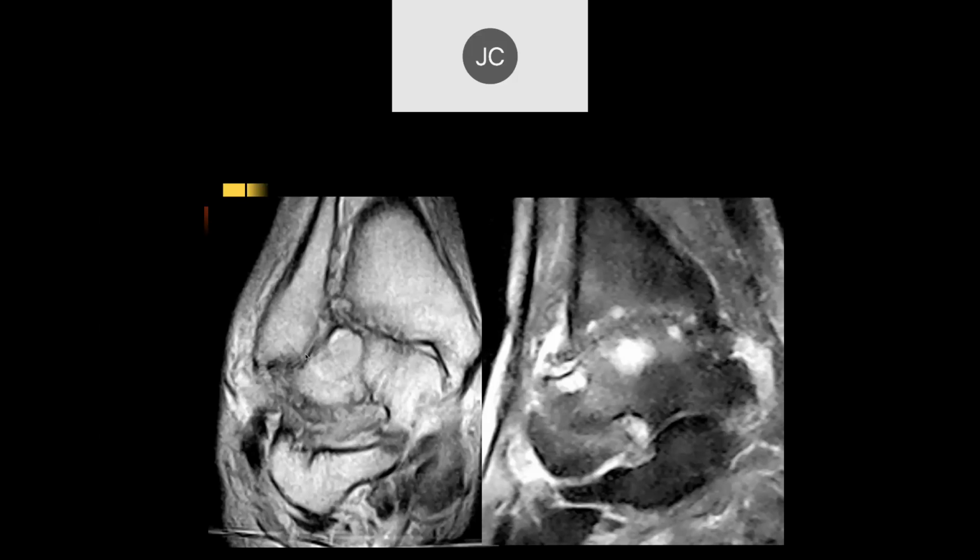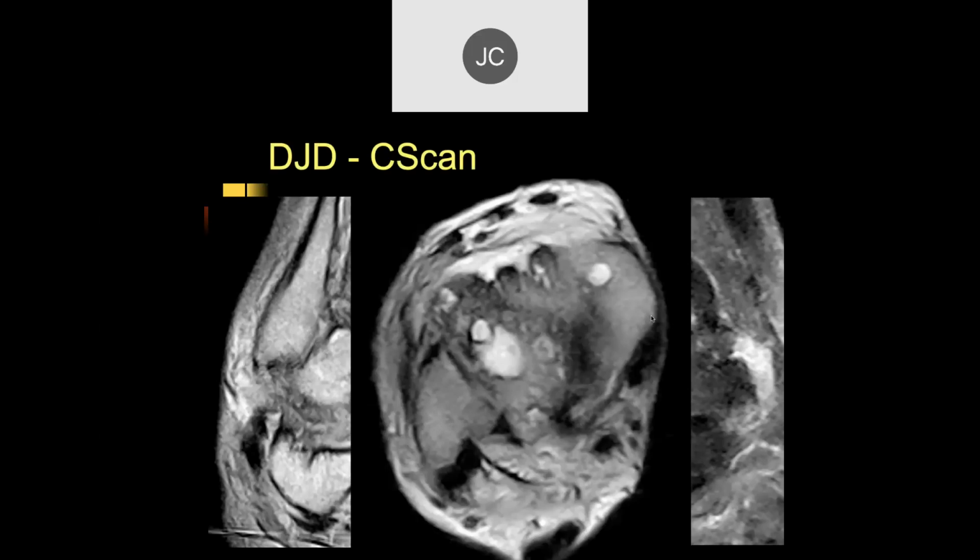Here we can see that there's a direct bone-on-bone articulation between the lateral malleolus and the lateral aspect of the talus. There's rotation of the talus, so you have lateral bony impingement here as well. But we can see this is very chronic because you have remodeling of the bone here. And in the sagittal plane, we can see all the degenerative disease and bone-on-bone articulation. Another low field scanner.